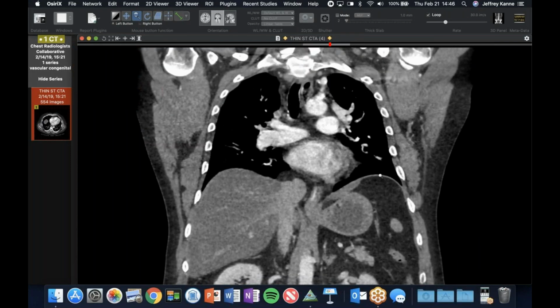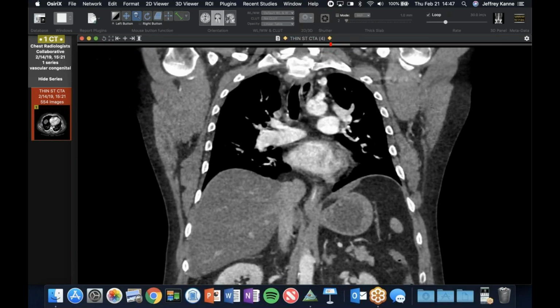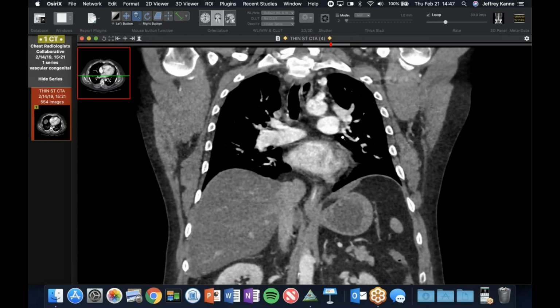There it is. So you can see there's this vein coming in, or maybe it's just a late, I guess it's not an early branching, but it's kind of a late fusion or coming together of those veins. But you can see the separate vein coming in right there. And maybe there's actually, I think, two. I think you've got this branch and then this branch more medially that drain the lingula right down in there.